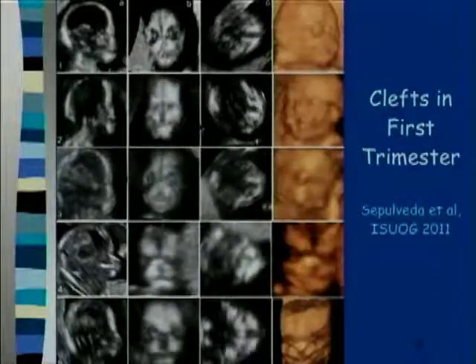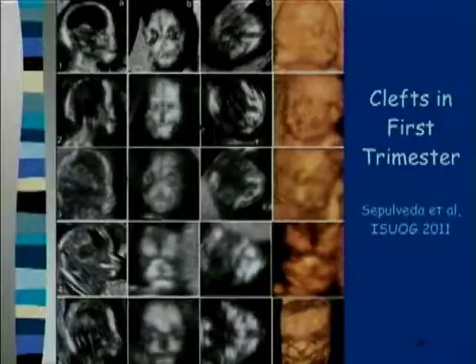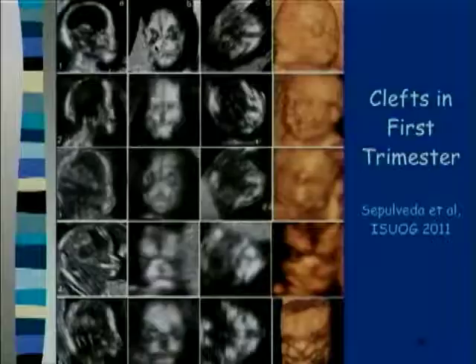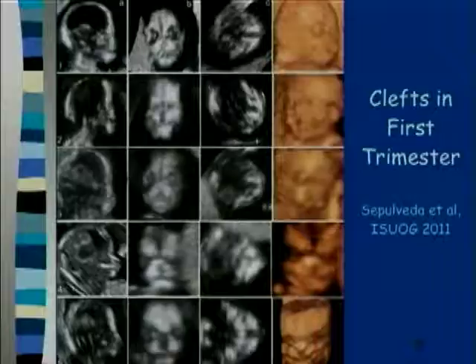Now, Dr. Sepulveda just last month presented a paper, a follow-up paper on his retronasal triangle, looking at clefts in the first trimester and showing that he could identify them, not just in the retronasal triangle, which would be out in this region, but that he also got the hard palate by doing the 3D volume and looking through it.